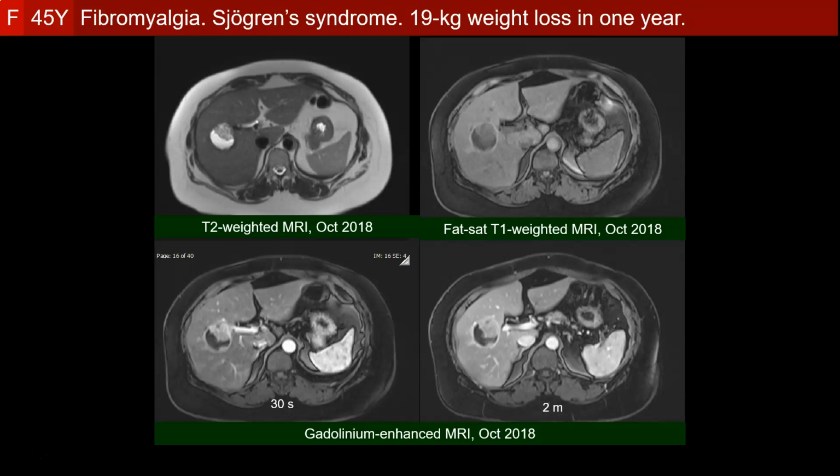Neuroendocrine tumor affects the liver more commonly as metastatic when it is located in other sites like the pancreas, the lung, or the intestine. It has two diagnostic features which we see here. The presence of a solid and a cystic component in the same lesion. Please note here that the cystic component is not a central breakdown, but the lesion is divided into two parts. One part is solid and one part is cystic, and this is a feature of a primary neuroendocrine tumor.